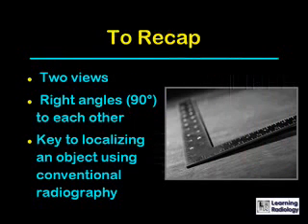So to recap, orthogonal views are two views that are taken at right angles to each other. They are key to localizing objects on conventional radiography.